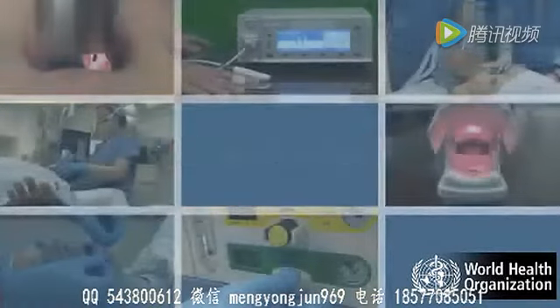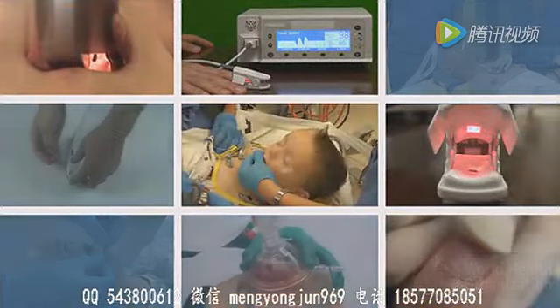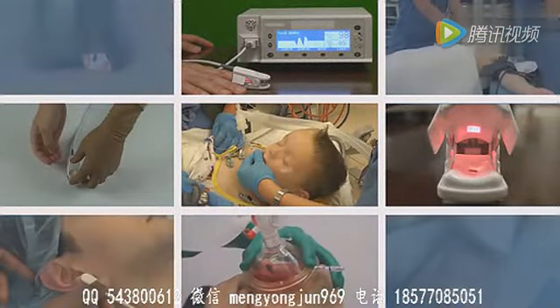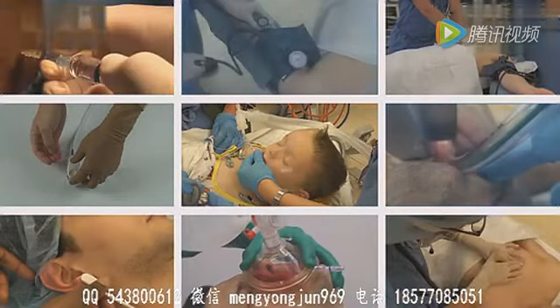Conclusion. We hope that this video has helped you to understand how a pulse oximeter works and how it can help you improve patient care during the administration of anesthesia.